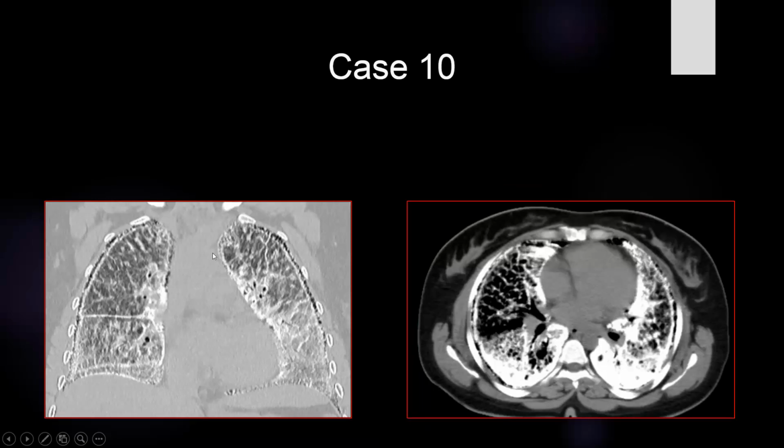Okay, this is a typical example of the features of pulmonary alveolar microlithiasis. We can see dense calcification involving the pulmonary interstitium, peripheral and central, with a characteristic distribution and characteristic affection of the pulmonary interstitium. This is the typical form of pulmonary alveolar microlithiasis. The extensive calcification and the distribution are pathognomonic for it.